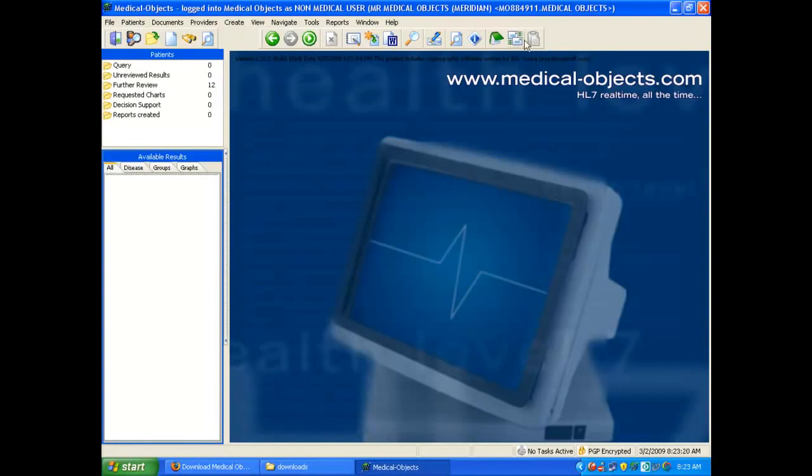You'll see that there are all these different icons that are lit up, and with these icons we'll be able to do a whole lot of different things, which comes in another installation or configuration video, which is how to use the Medical Objects Explorer. That's in another video on the website that you can find and watch when you're ready to start using the Medical Objects Explorer. You notice that up the top though, it does say that we're logged into medical objects.